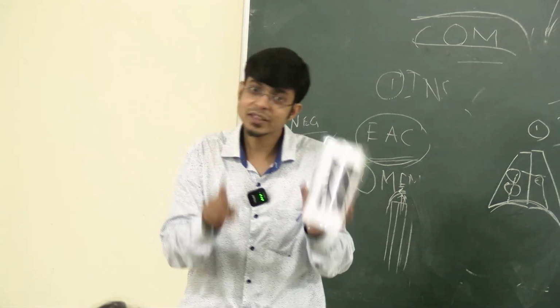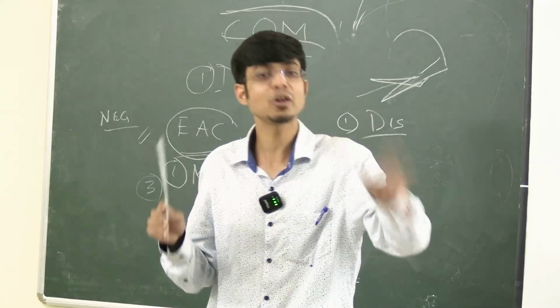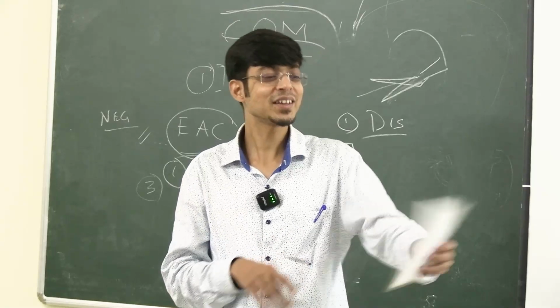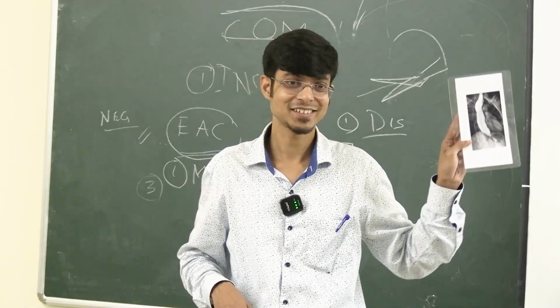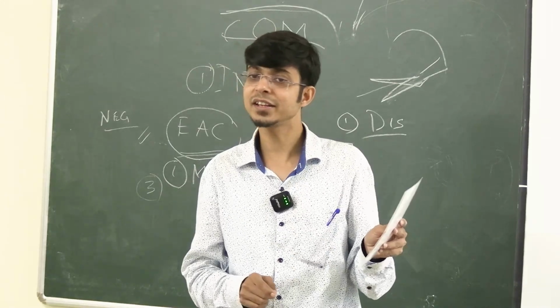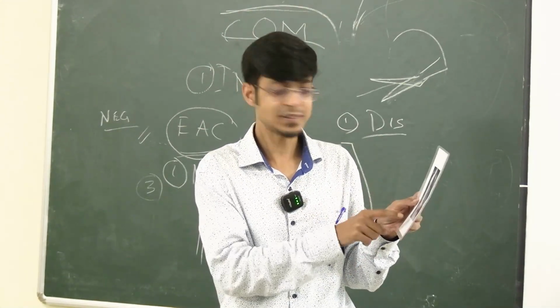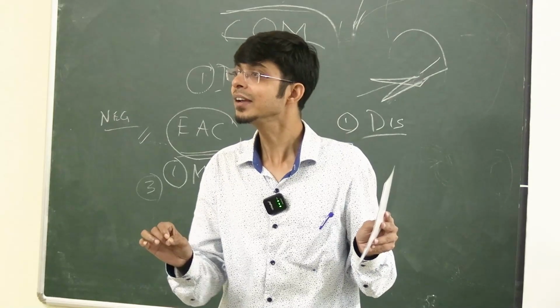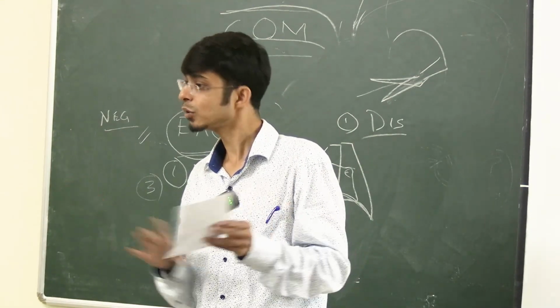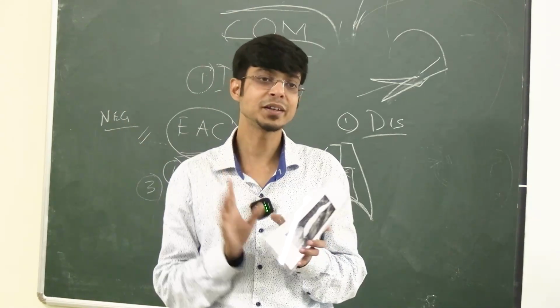You cannot diagnose like that. See, for the diagnosis of Achalasia Cardia you need to do pressure monitoring, you need to do pH monitoring. You don't have those. Just with an X-ray we cannot say like that. So explain the X-ray in detail, whether it's an AP view or a lateral view or whatever, then say what your finding in the X-ray is, and then say the most probable diagnosis. Go step by step. Don't rush to the diagnosis first. There's a wrong way of explaining an X-ray.